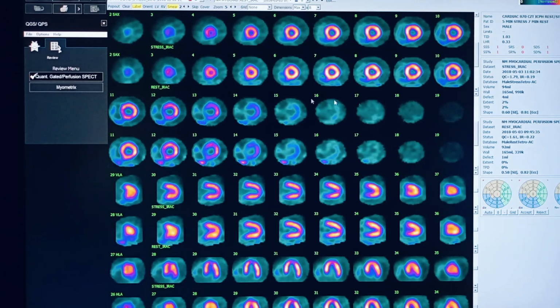Or the second way is to generate thinner slices. If you generate thinner slices, there will be more slices. Currently it's around 6 mm. In the customization setting, you can go and change it to 4 mm. So you will get more images.